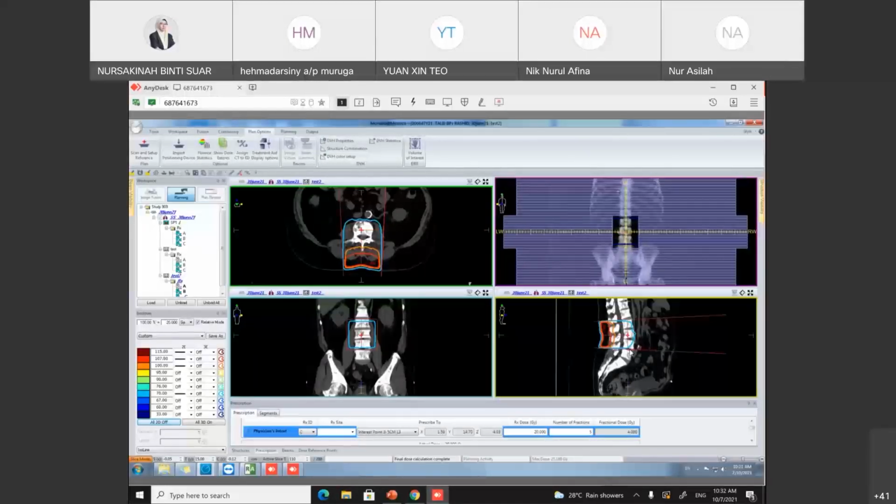It's impossible to put our weight point, meaning the prescription point, at the vertebra for one posterior beam. Just now you saw when we put the prescription point at 5 cm depth, the posterior part was already 15% higher than the maximum dose.